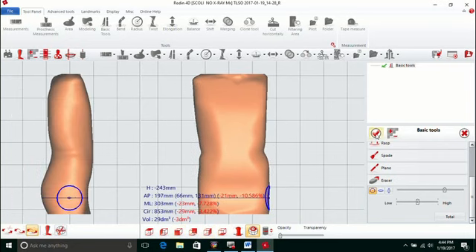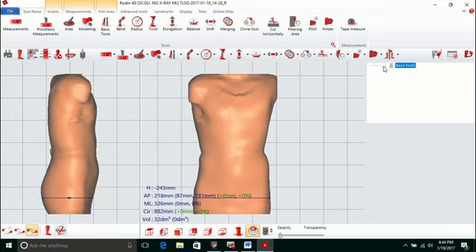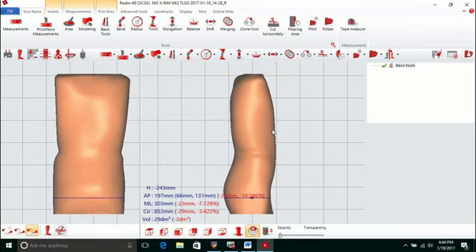To save your tools, check mark, left click on that, and then it collects it over here, either on the left or right side depending on your preference. So if you uncheck this tool, it brings you back to your original. Alright.